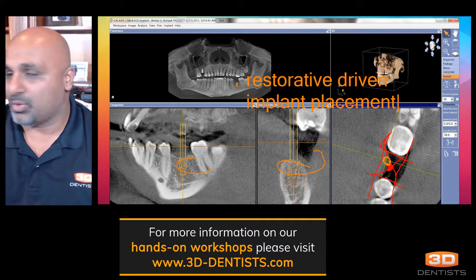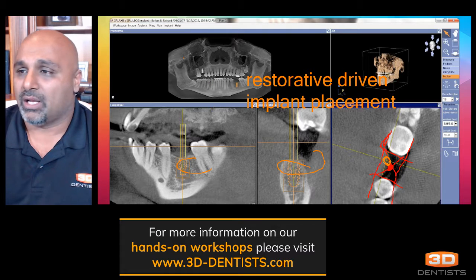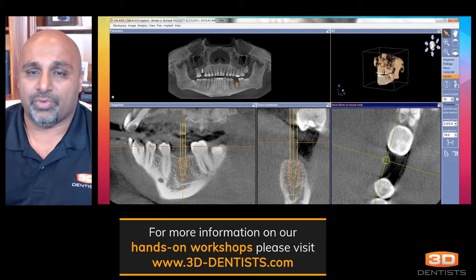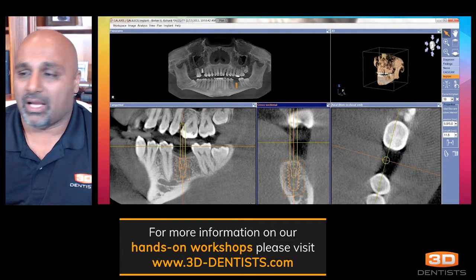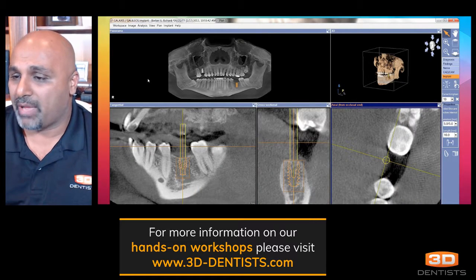So we want to make sure that we're keeping our eyes on these facts as well. So just kind of some food for thought to give you some ideas there. And here is the plan adjusted. Again, if we go back and forth here, we can see it's hardly anything.